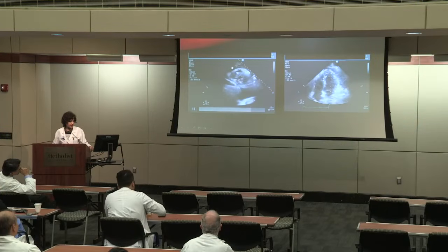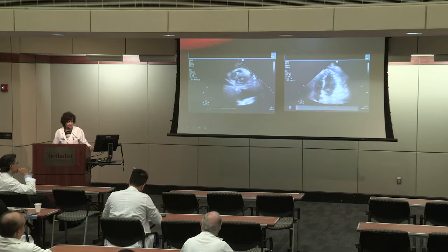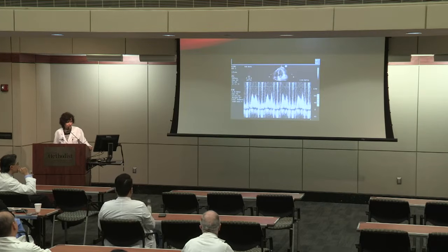Again, you're seeing a collection anteriorly, posteriorly. Again, you're seeing it here anteriorly with the lateral echo density. Again, LV function is not the greatest. No evidence here of the RV free wall not being compressed. Again, emphasizing the multiple views required to determine the tamponade physiology.